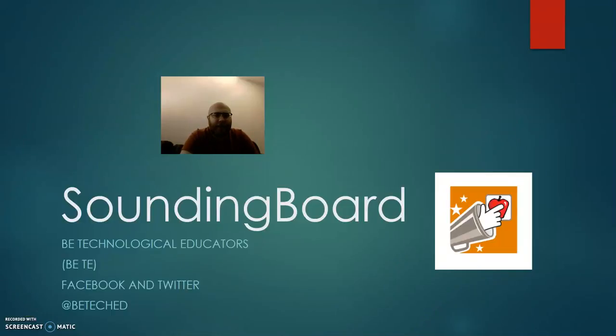Today we will be doing an overview of an iOS application called SoundingBoard. SoundingBoard was created by AbleNet and it is an AAC, Augmentative Assistive Communication, application. It's for students who use different communication devices in order to communicate with their peers, teachers, family, friends, and just people in their surroundings. It's a great application. It's free. It's available on both the iPhone and the iPad.